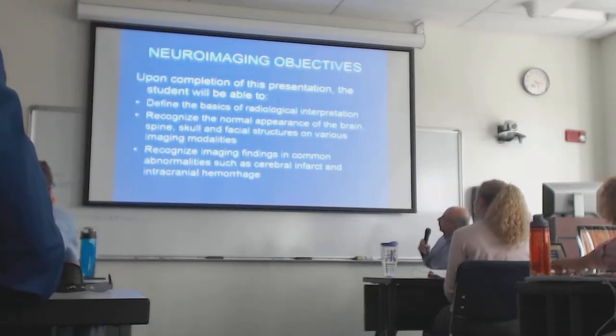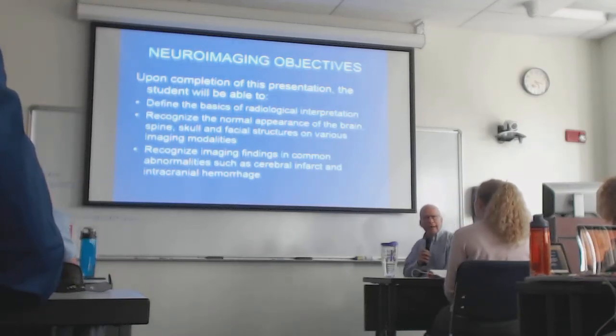Interpretation, the normal appearance of the brain. I will go through a little more anatomy on this section today.